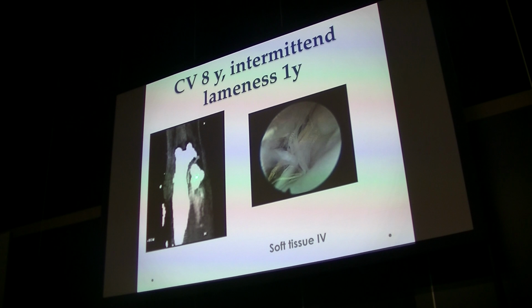Here as well, this is also a CT image where we really see the enhancement of contrast in this dorsal reconstruction. We see the attachment also on arthroscopy, and you can say, oh, the attachment is outside the joint, so it's not possible that we see it during arthroscopy. Often in these cases, due to the inflammation and the fibers that are present at the tendons at that level, they attach at the level of the joint capsule or just run on top of the joint capsule, if you imagine.